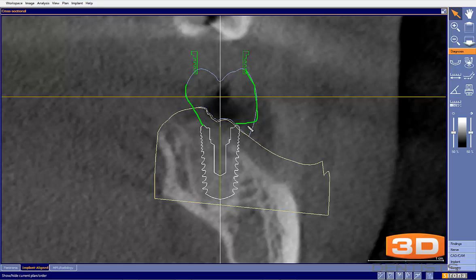And that area, sorry, we would have a nice emergence profile here, but right here we'd have that, and this area right here would be a tremendous plaque trap. So as we know, that does correspond honestly to where our margin should have been drawn, more like that.